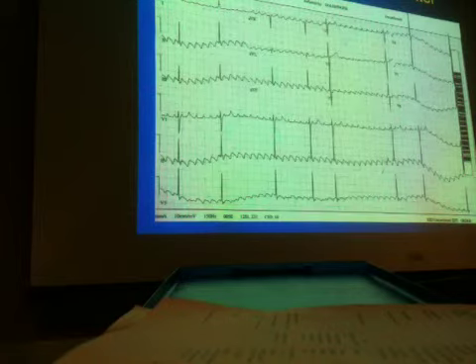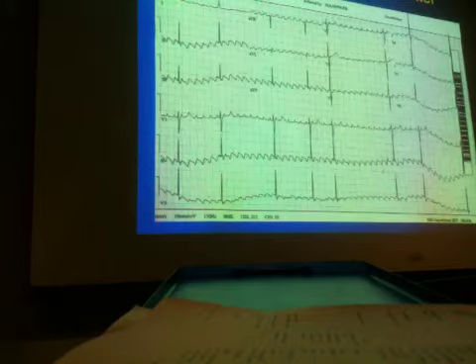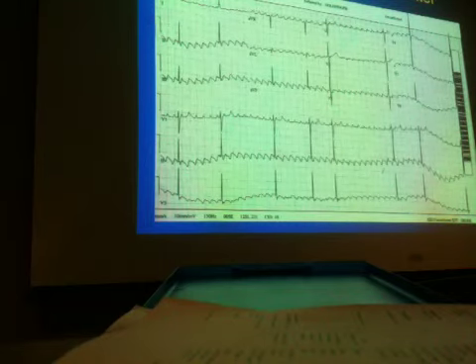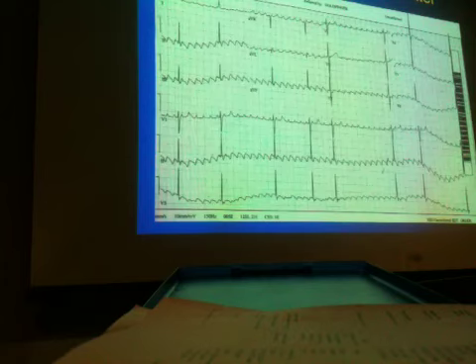So they're very distinct P waves in flutter. In fib, they are very indistinct. Even though they are there, we just can't see them because they're fibrillating. They're all over the place and too tiny to really see, tumbling all over the place. Whereas in flutter, you have very distinct P waves. You don't always see this beautiful sawtooth pattern, especially in 2-to-1 flutter, where you only see 2 flutter waves if you're lucky. You have to know what to look for.